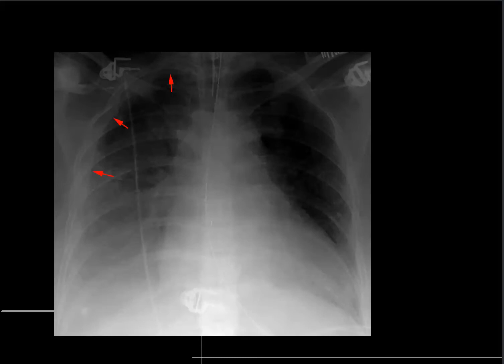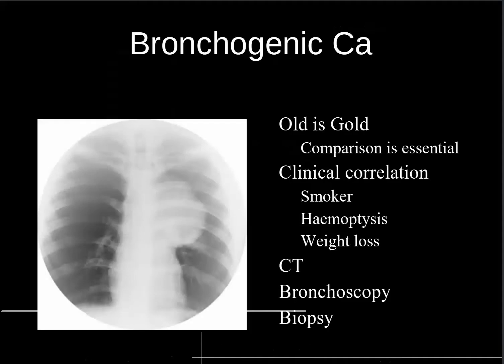So let's talk about other airspace opacification, and one that we are seeing actually more now because people who had minor symptoms are presenting now, having not seen their doctors for a couple of years because of the whole pandemic. Is bronchogenic carcinoma.